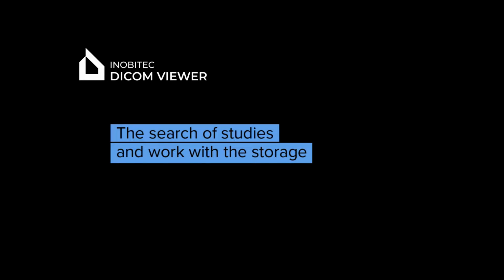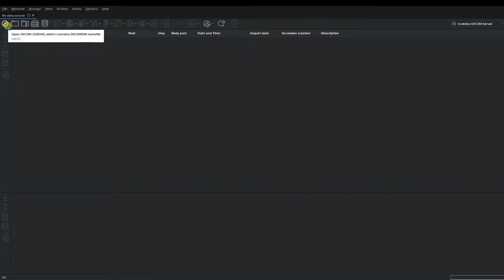Inobitec DICOM Viewer. The search of studies and work with the storage. You can search and open the DICOM studies from different types of data sources. Opening a study from the disk.